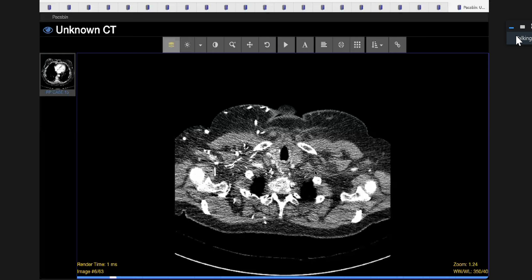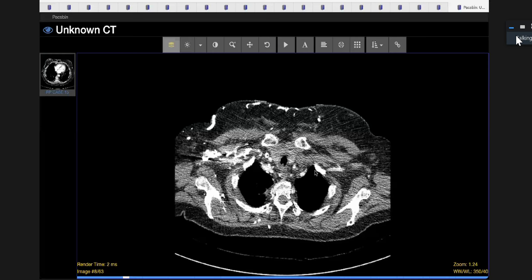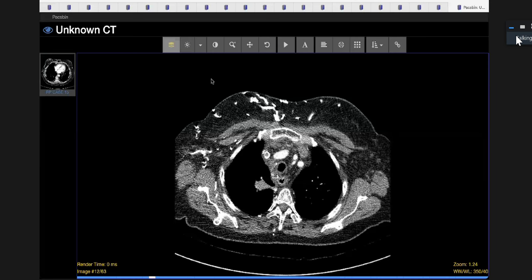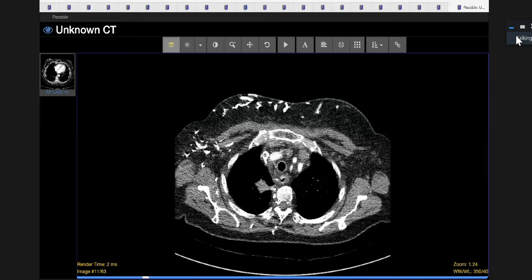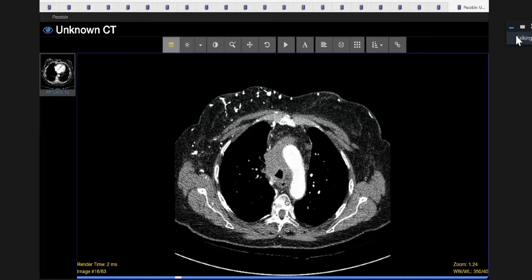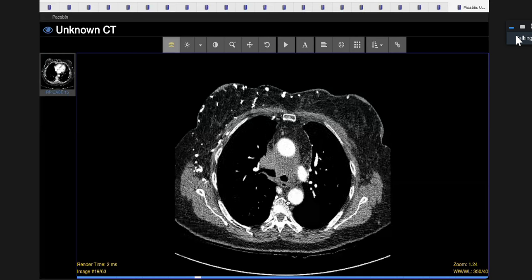What's in the right upper lobe or right apex? So there is a tumor. Should I change the window for this? Can do, but you can see it. Yeah. So there's another soft tissue lesion in the upper lobe, and then the soft tissue you're seeing in the mediastinum is the associated malignant lymph nodes. Right, and that's what's causing the SVCO.